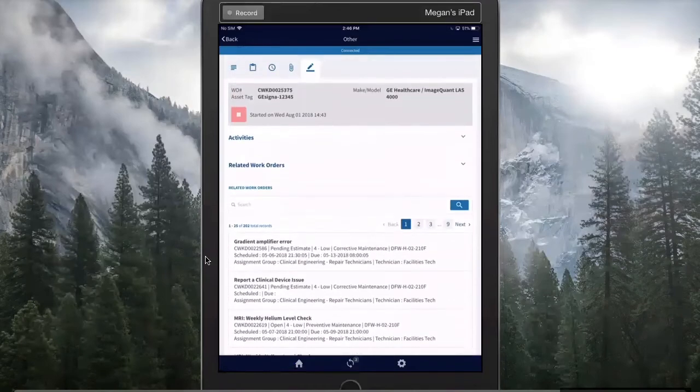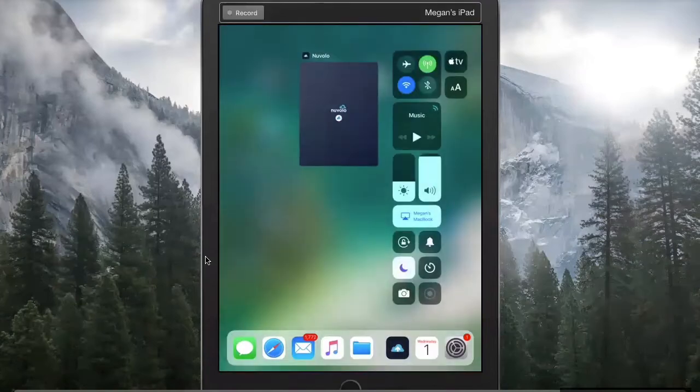All right, so I'm going to get out of that here and we'll dive into some analytics.